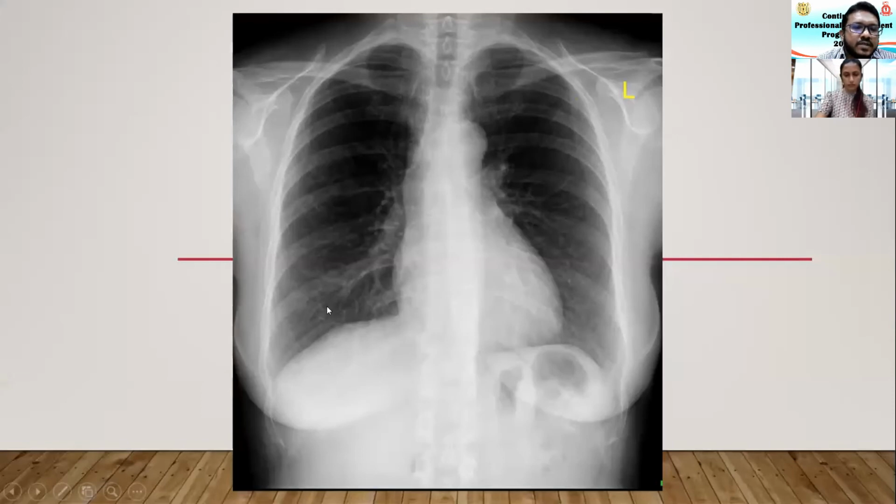Then you will have patchy consolidations, or what you call ground glass opacity. That is a veil-like opacity, but patchy, peripherally located, mainly in the lower lobes. Then with progression, it will be more like consolidations. Then it can go up to ARDS, with diffuse ground glass opacities in the chest X-ray. Full-blown pneumonia will be on both sides, not a particular lower lobe predilection.